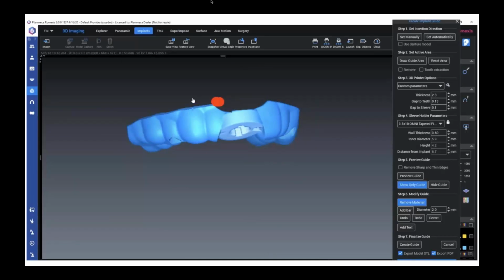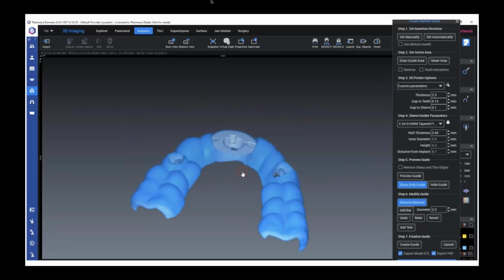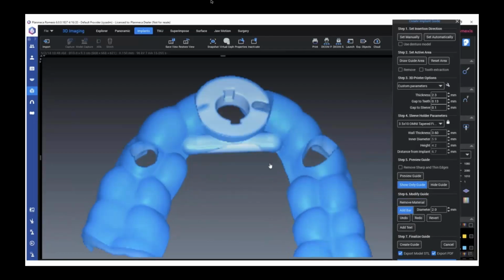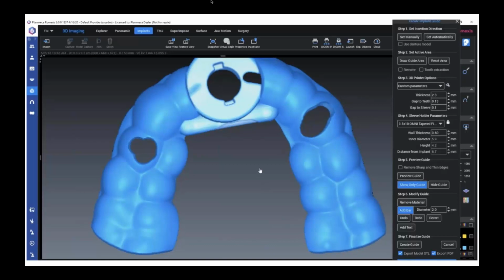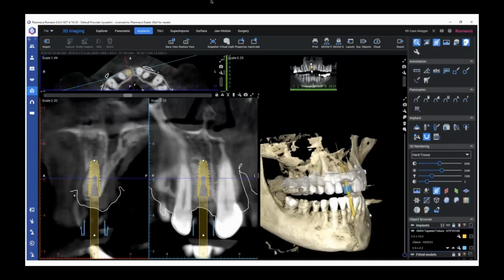If you have a multiple edentulous case, sometimes the material can be thin between the edentulous sites, so you could even add a bar for support. It's very easy. Click the origin and termination for those two sites, and you can add a bar for support, and we're done.